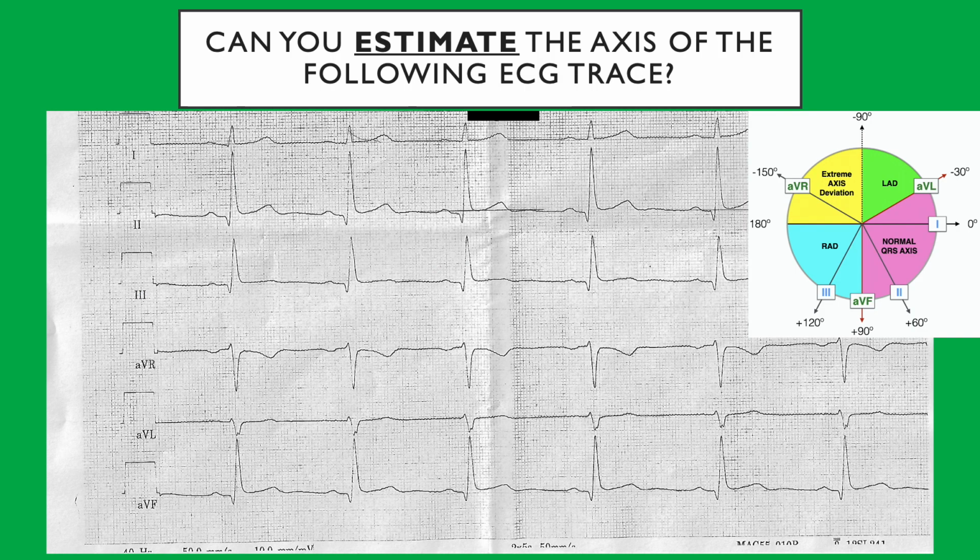Can you estimate the axis on this one? How many degrees do you estimate it? Tell me a number. Instead of calculating exactly the number, you just estimate. I think it's between 40 and 50. 30 and 60. Sorry, 90 and 60. Between 60 and 90.